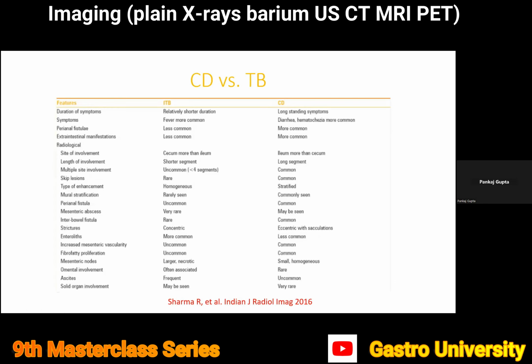This is an important topic: differentiation of ileocecal tuberculosis from Crohn's disease. At least in tertiary centers, we are commonly faced with this dilemma. And these are just features that can guide us. Mind you that these are not absolute, and overlap is very common.